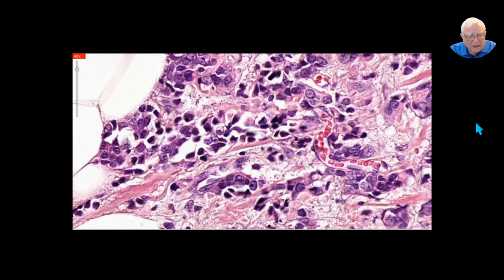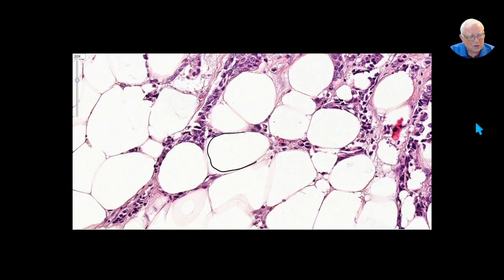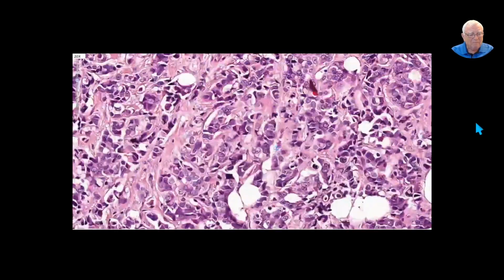For example, we are going to grab that little vessel right there, full of red blood cells. When we have broken into that, then we are moving out to the interstitial space. Here are the fat cells tightly packed to each other, and among them there is the interstitial space. And I'm trying to mark the cancer cells in that. The horse is out of the barn. Really.